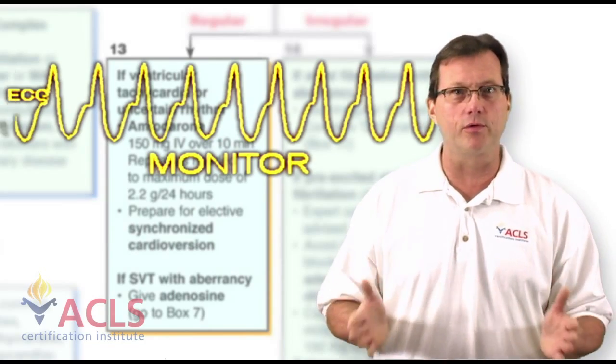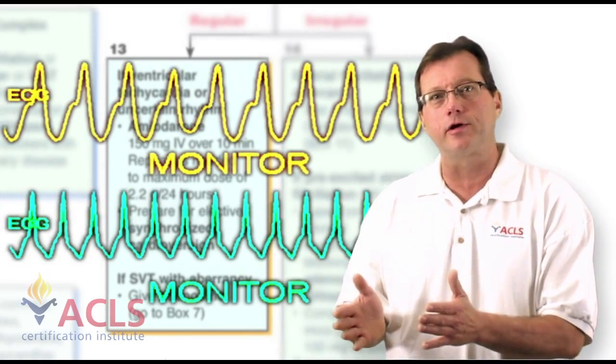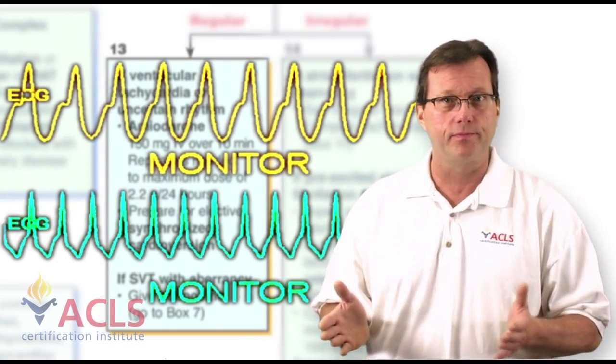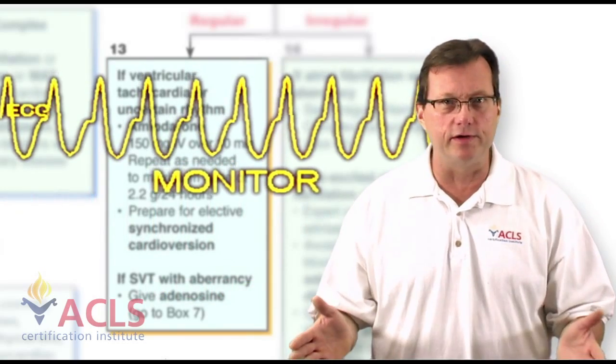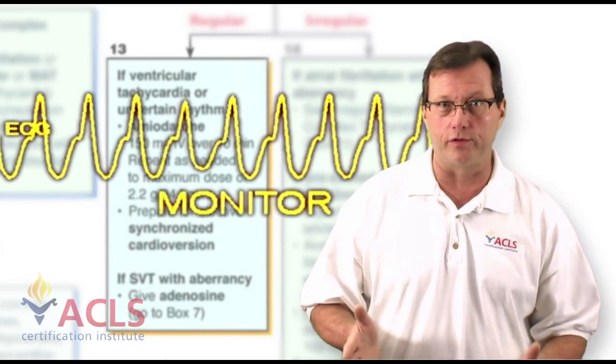Sometimes it's hard to discern whether it's truly ventricular or supraventricular with maybe a conduction problem that's making the complex a little wider. So the literature says, when in doubt, treat for VTach. Treat as though it's a ventricular rhythm, it's ventricular in origin.